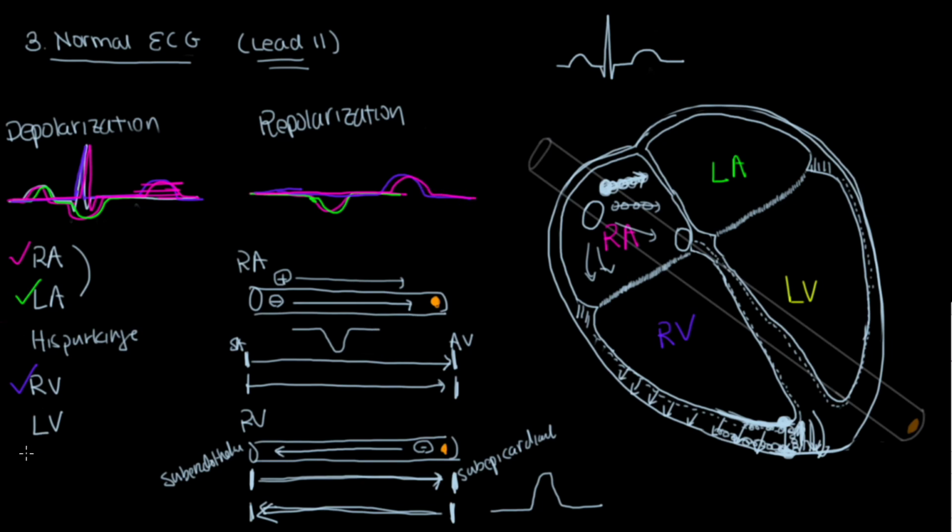All right, and then we said we're gonna hold off on the His Purkinje. So sometimes the His Purkinje also depolarize down here, and we had the little blip here for that, right? And for the His Purkinje, usually the depolarization of that also happens similarly to the ventricles in that it moves upwards.